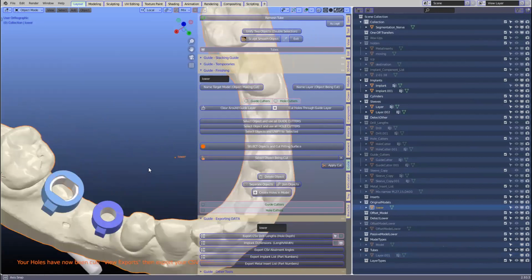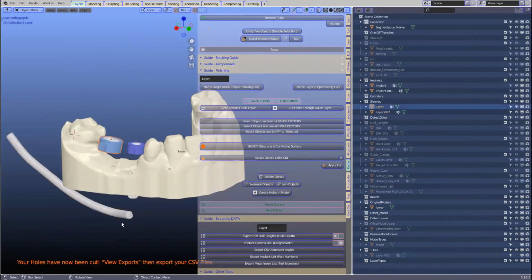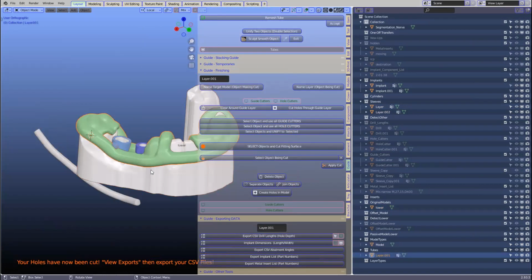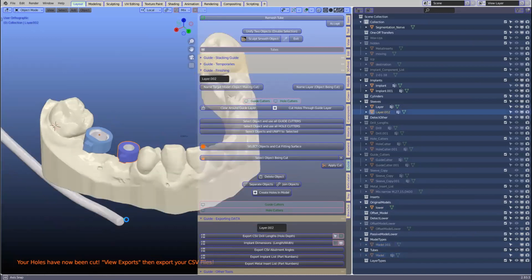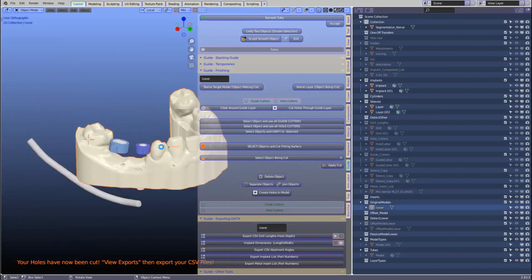No, it hasn't cut it. I don't know. Did it cut it in the target model, Michael? No, I don't think so. I shouldn't have hidden it. That's a problem. It was hidden away, I think. Okay, try again. Let's try again. It's thinking. No, it hasn't done it. Oh, well. Okay, we'll just have to leave that for now. I'll have to check into it.